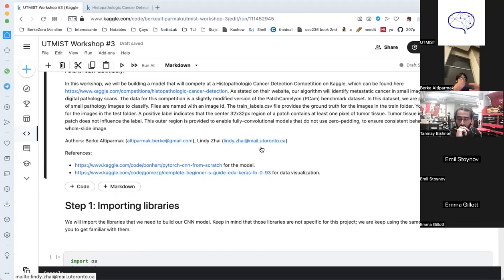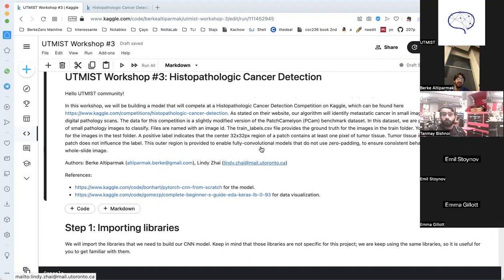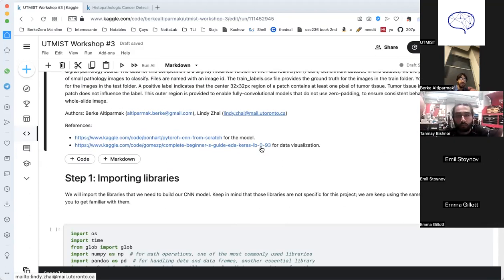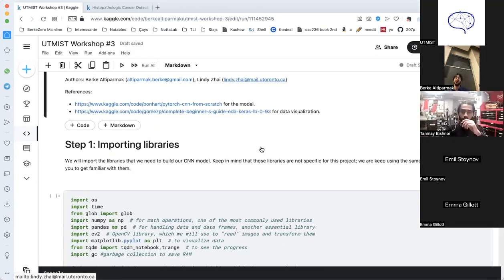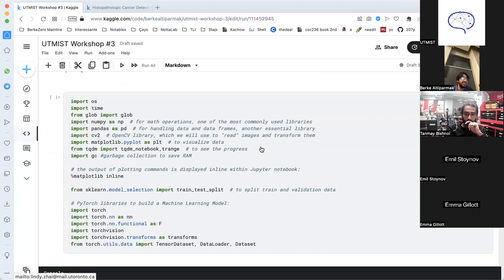We will divide our project into 3 parts. First part, we will try to understand what our data is. We will closely investigate our data, look at our images, and then do some statistics with that. The next part is data processing, because 80% of machine learning is just processing data. Building the algorithm is only 20%. After processing our data, only then we will start building our model. And at the end, we will use our model to predict the images that we have not trained on. So let's start.